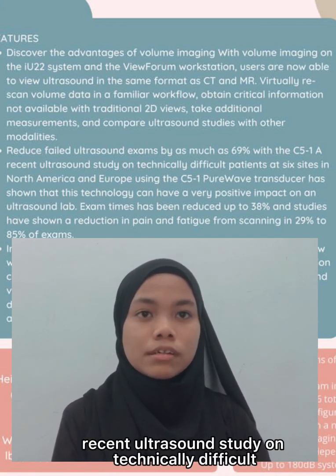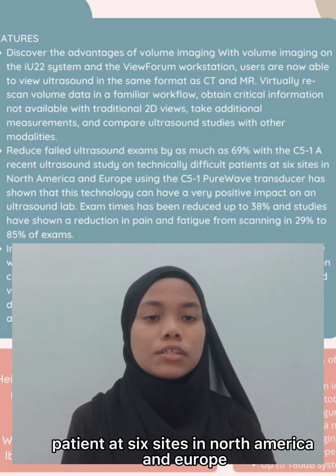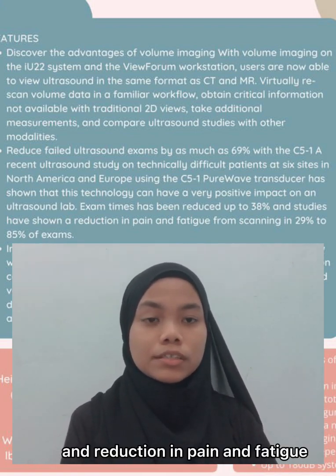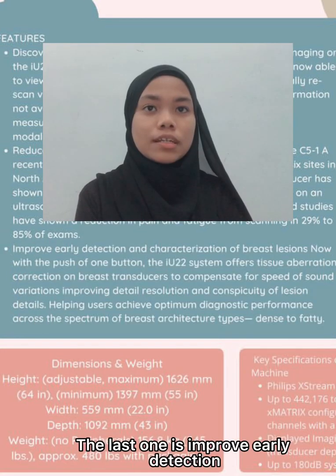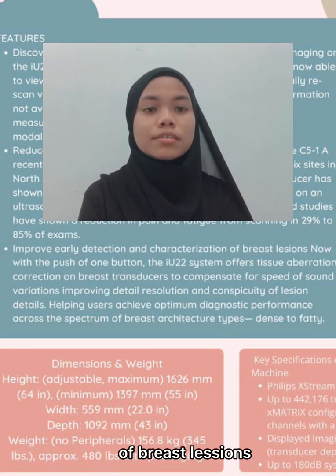In a recent ultrasound study with the C5-1 on technically difficult patients at 6 sites in North America and Europe, exam times were reduced up to 38%, and there was a reduction in pain and fatigue from scanning in 29% to 85% of exams. The last one is improved early detection and characterization of breast lesions.